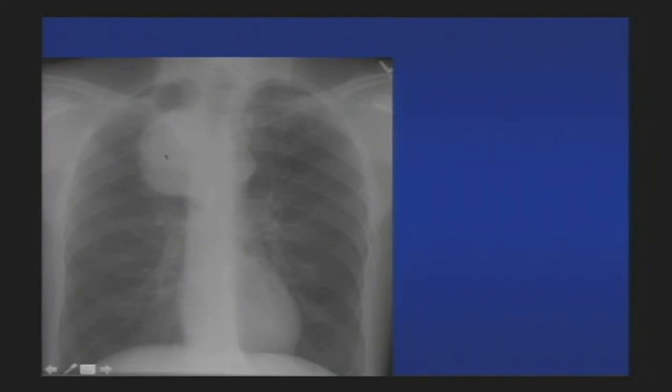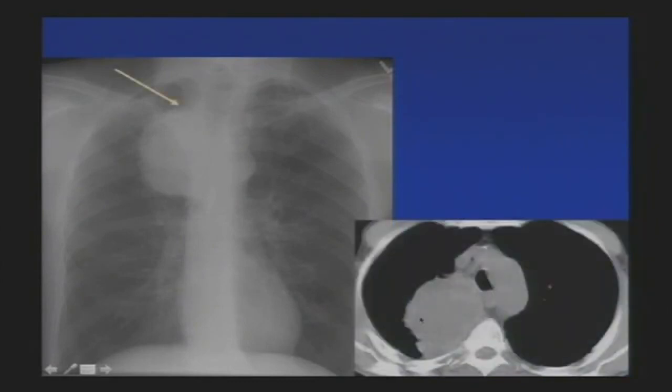This is an example of a lung cancer that has obtuse angles with the mediastinum, and the reason for that is that it's actually invading into the mediastinum because it's an aggressive lesion. So if it's a small lesion, this distinction is usually quite accurate. As it gets bigger and bigger and bigger, particularly when it's very aggressive, it becomes somewhat less accurate.